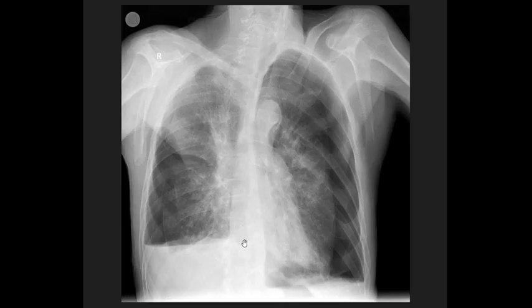In this case, actually, this is a very interesting case where we have also two pathologies. So both lung fields look problematic. I will just say it like that. So first we look at the lung markings, and we come to the line here, and we see this is the line of the pneumothorax, the line of the visceral pleura. This is a pneumothorax on this side. Then, as we look at this side, there is also a line, there is also a pneumothorax on this side.